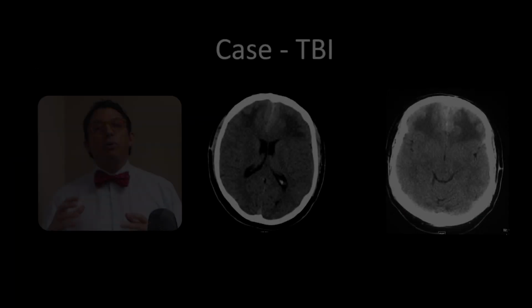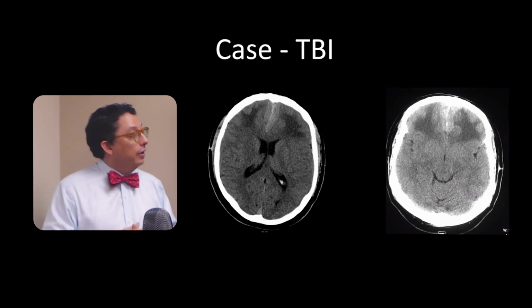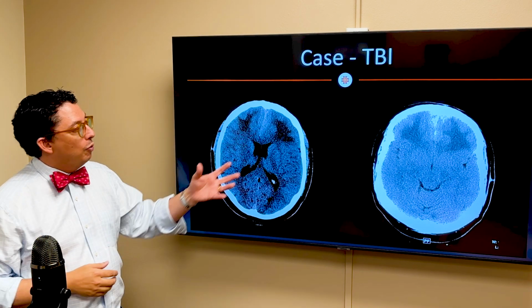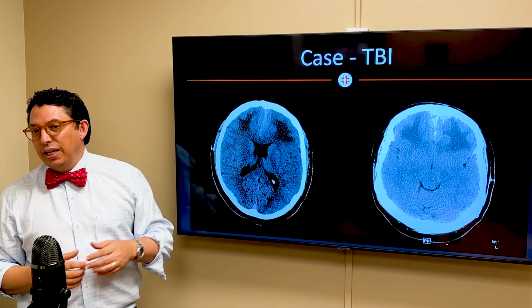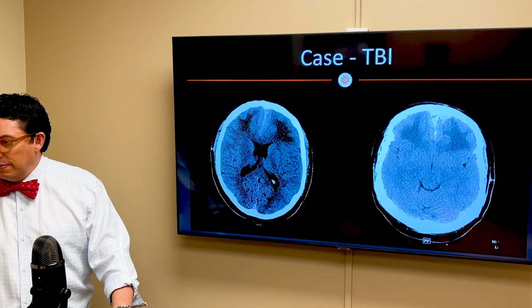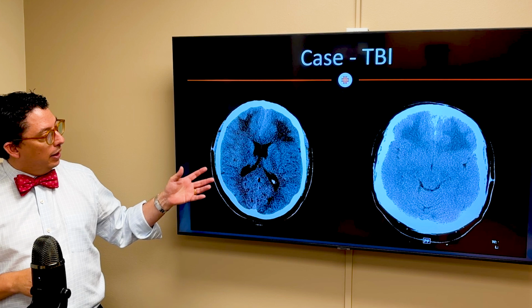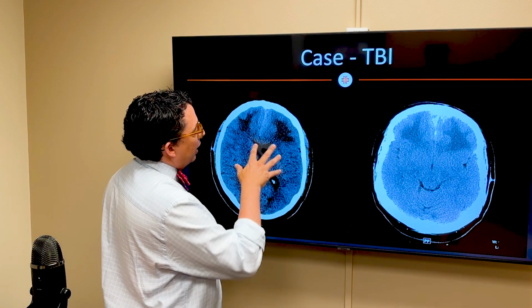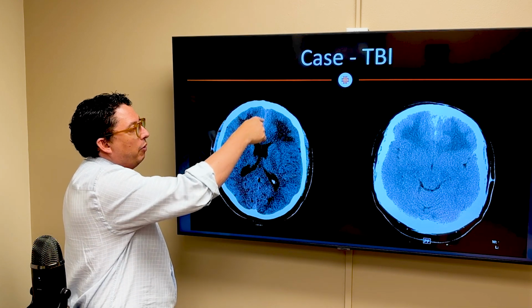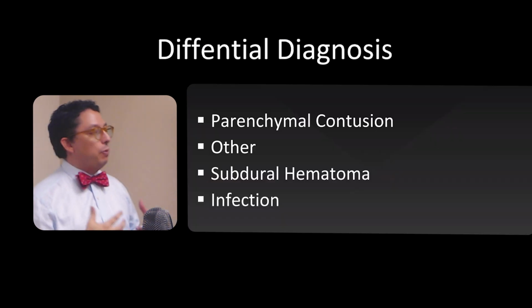We're going to start, of course, with our oddball case. I always start with something that looks like something else. So here we have a case with increased density around the frontal lobes with low densities, edema in the frontal lobes. Edema, it's only in the white matter, so this is typically vasogenic edema in a patient that had trauma. So we saw this patient and we said, this patient very likely has contusions in the parenchymal lobes. He was found falling down with some very possible subdural hematoma. So when you saw that, we thought it was parenchymal contusions.